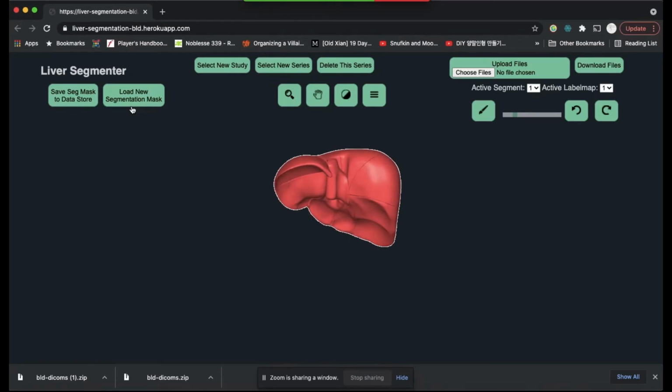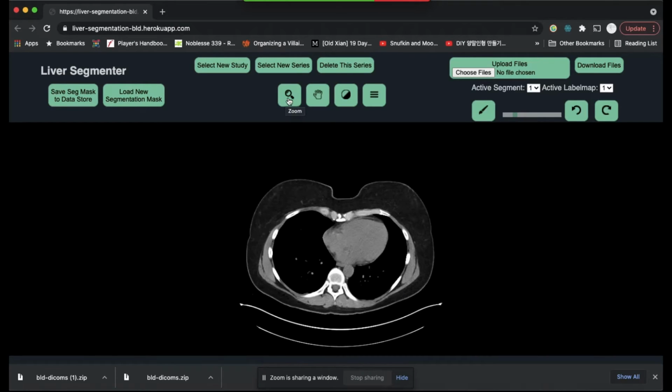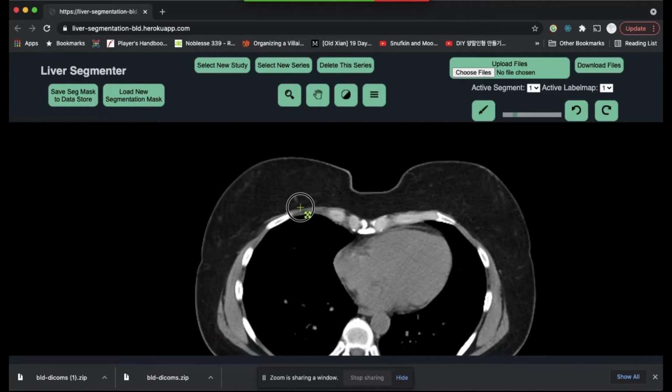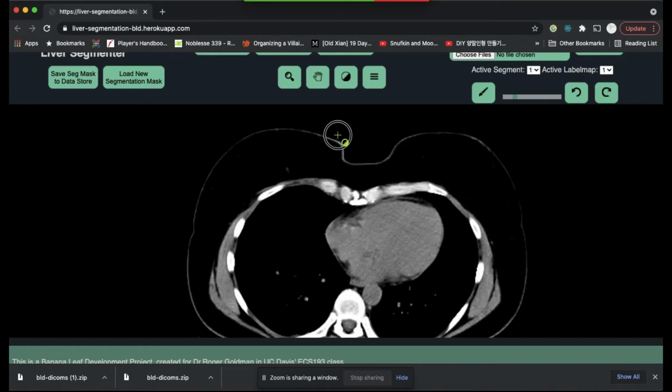When designing our interface, our client sent us MIM and Aquarius as inspiration. We also found Slicer and OHIF Viewer as our own inspiration. We extracted common base features from these programs and implemented them to provide a familiar DICOM experience for our users while still on the web.